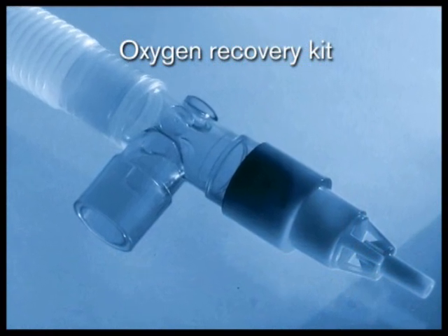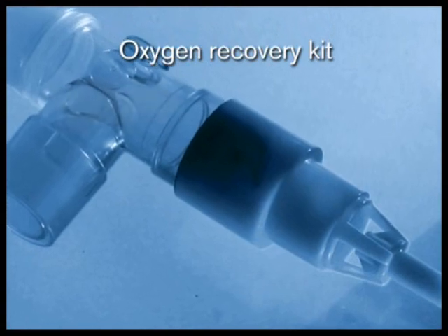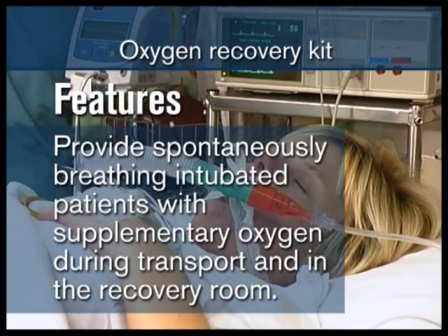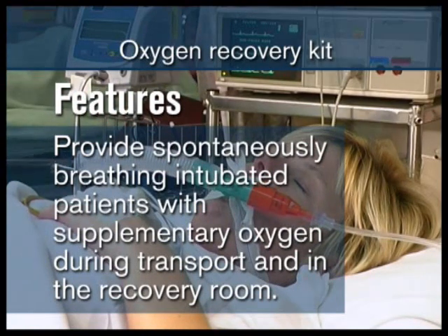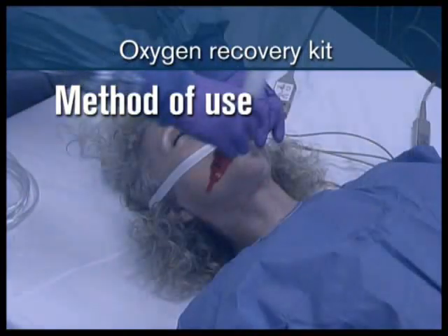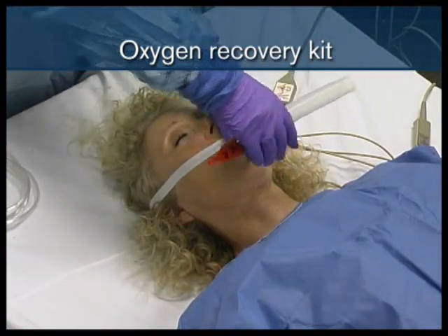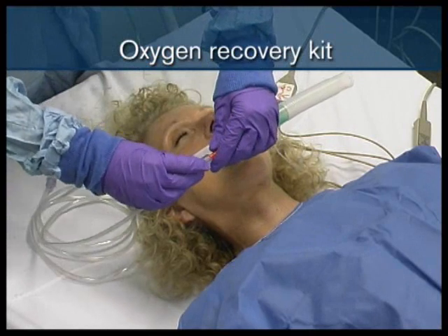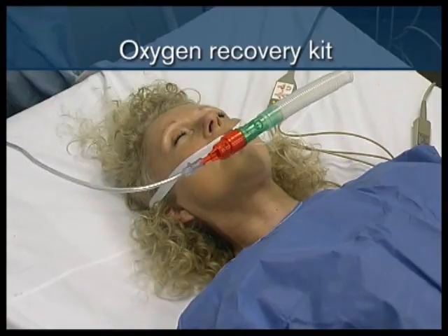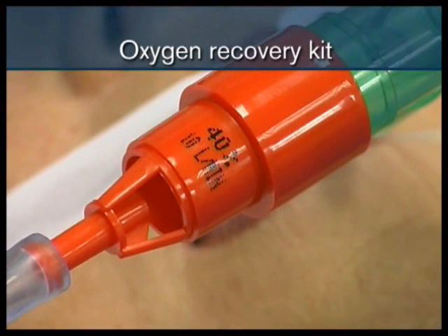Fixed Venturi valves can also be incorporated into oxygen recovery T-piece kits. The most popular is the 40% valve. These are used to provide spontaneously breathing, intubated patients with supplementary oxygen during transport and in the recovery room. Connect the T-piece to the 15mm connector of the tracheal tube or laryngeal mask airway. Attach one end of the oxygen tubing to the valve spigot and the other to the oxygen flow meter. Set the flow meter to the flow indicated on the valve.